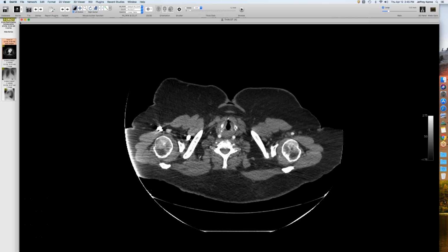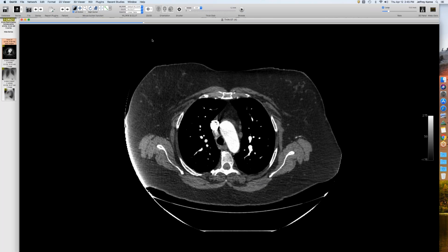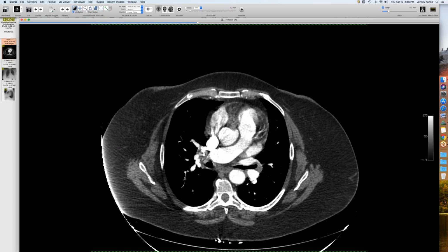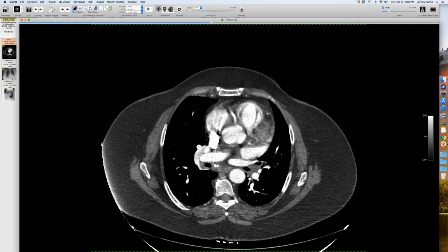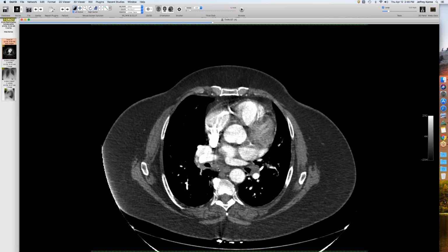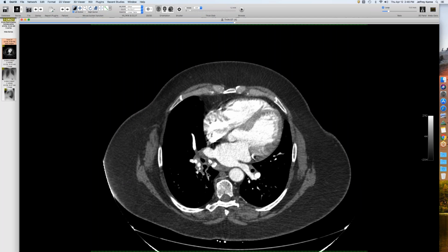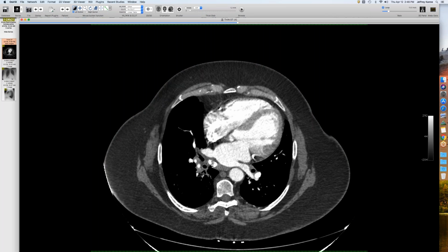Here's a good Midwestern special. So this is a variant of mediastinal fibrosis. And this patient had this hilar soft tissue here. And you'll notice this was a PE study. We see calcified lymph nodes all the time. I consider them a normal variant of the Midwest, and the hilar nodes as well. But this patient just has too much soft tissue around the hilum. And did I show this case already?